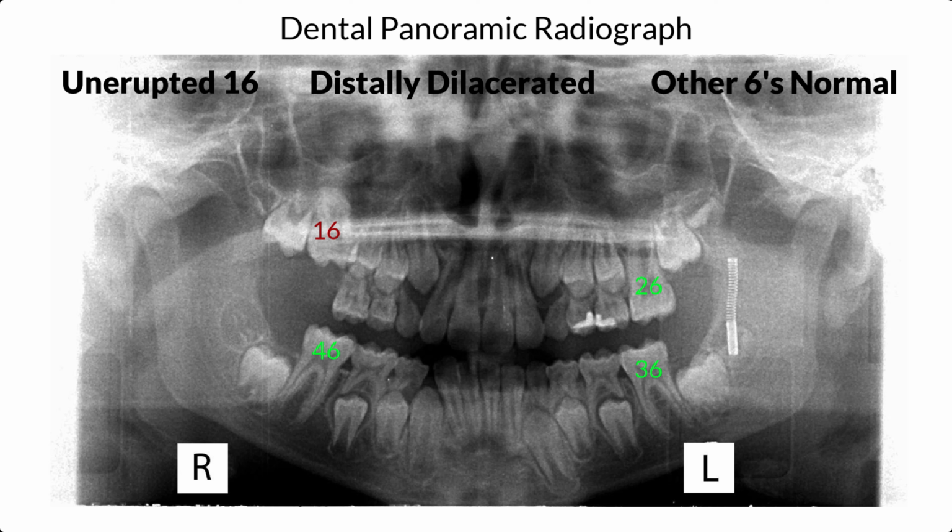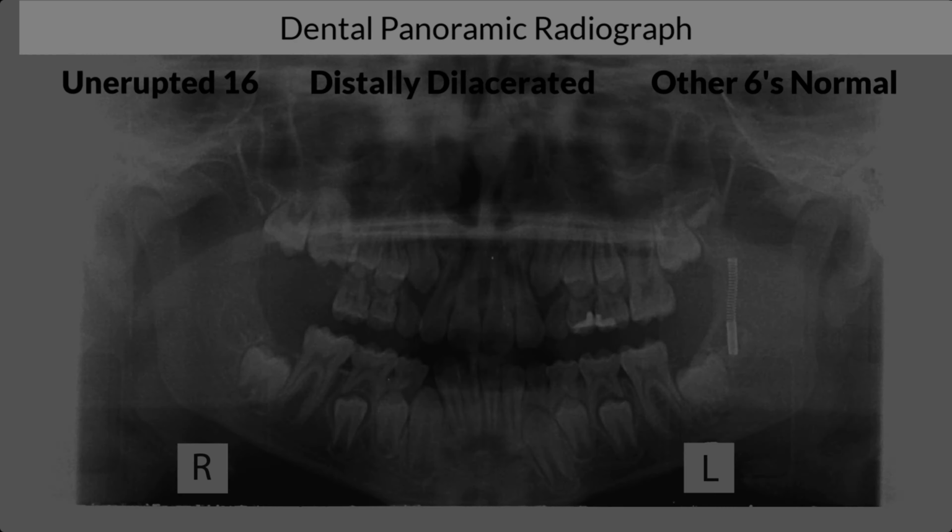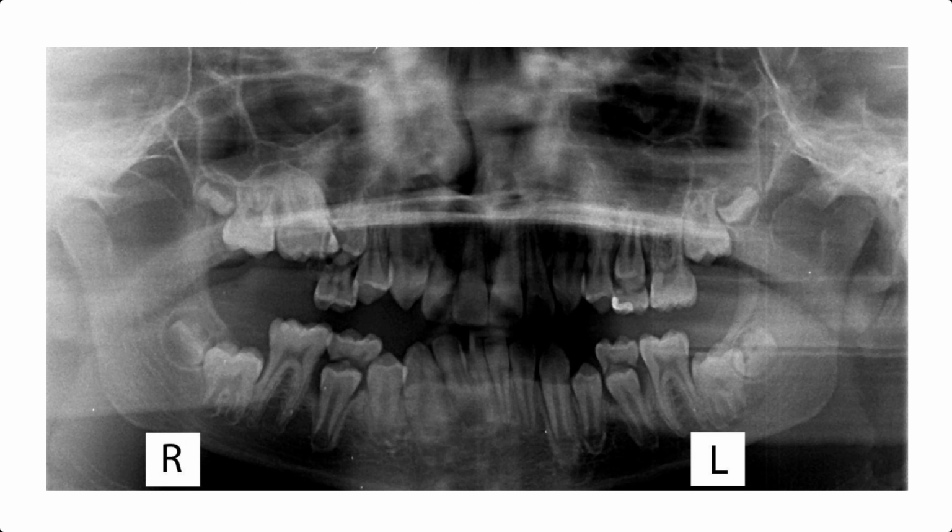Importantly, there was no cytologic atypia, necrosis, or significant mitotic activity, confirming the benign nature of the tumor. And so the diagnosis of ameloblastic fibroma was made. 3 years down the line, the patient returned, and unfortunately, tooth 1-6 remained unerupted.